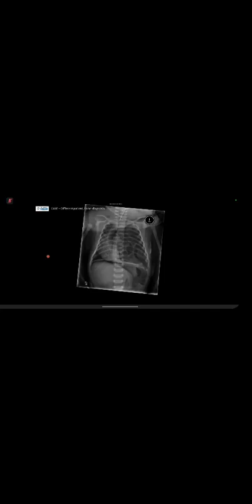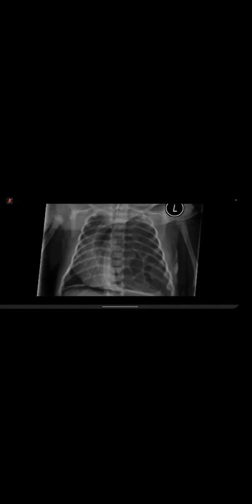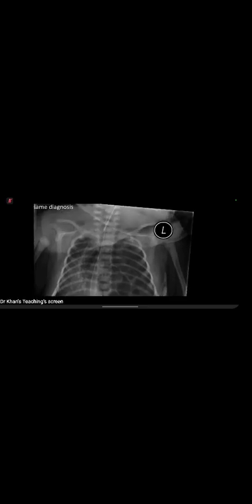Can you just show where the pneumothorax is, please? Yeah, sorry. Can you just see this lucency here, and then there's a line between the rib? We can't see your pointer. It's gone. Oh, okay. Can you see it zoomed? I zoomed it a bit. Yeah, we can see it zoomed.